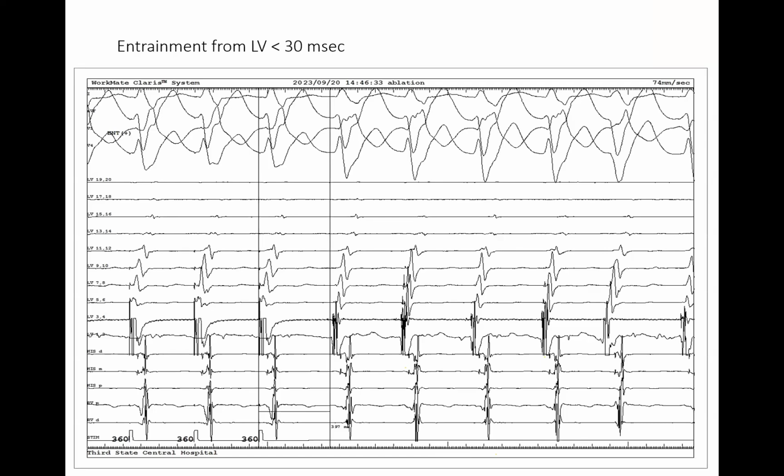And Dr. Pitch Manuel in San Francisco also asked a question to Dr. Saro. He's asking whether you tried entrainment pacing or resetting of VT in the LV. We did that already. Yeah, this one? Okay. This is the entrainment from the left ventricular free wall side, and the entrainment was less than 30. It had 397 somewhere. Yeah, it's 397. So we had tried entrainment.